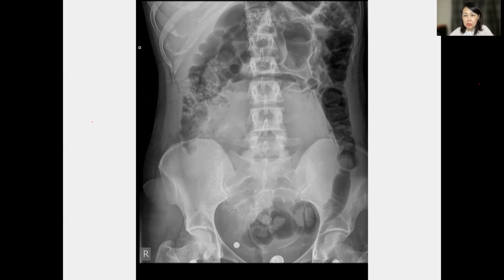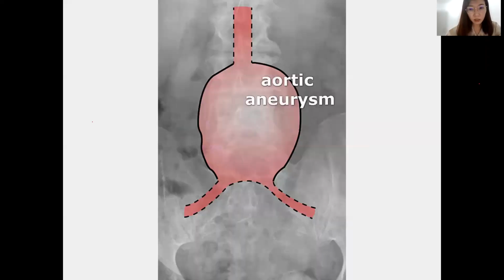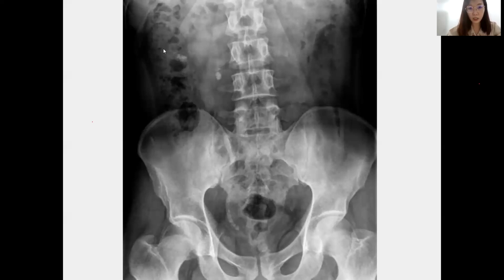So there's a gravid uterus, right? You see all the bowel already displaced peripherally, and you see the opacity here. If there's a mass in the center of the abdomen, the bowel will displace peripherally. Going back to the previous slide, in this X-ray the large bowel is peripheral and centrally is the small bowel.